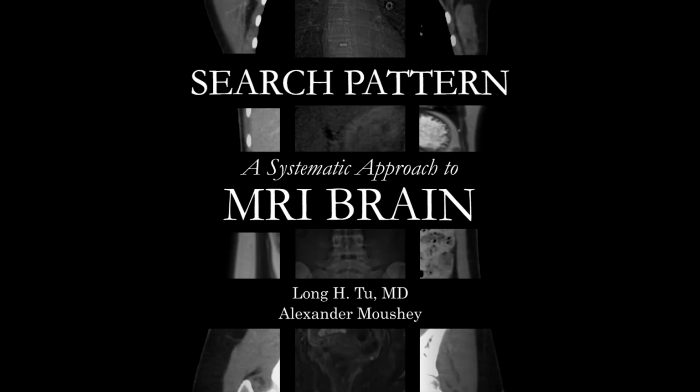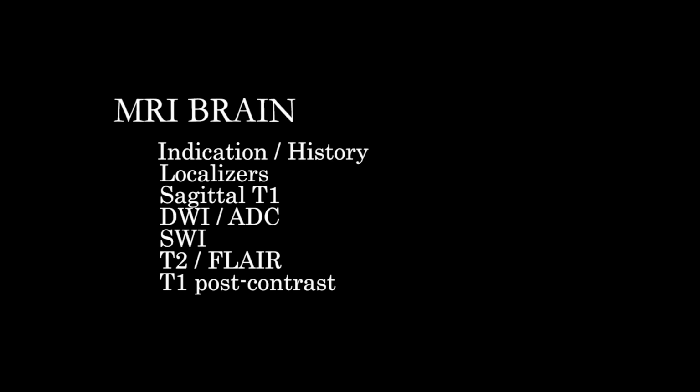All right, guys, today we're going to talk about an approach to the MRI brain, one of the most common studies done in neuroradiology. So as usual, the way we're going to start is to get a sense of the indication, the patient context, and history leading up to the study. And then we're going to take a look at localizers and then sequence by sequence, in whatever order they're provided, we're going to go through each part of the anatomy.